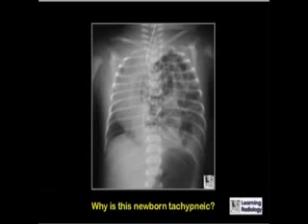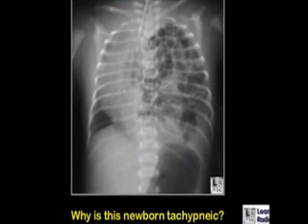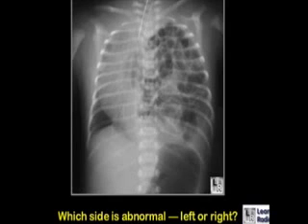Why is this newborn tachypneic? Well, one of the first things you have to ask yourself whenever you're looking at any image is, number one, is it abnormal? And number two, which side is abnormal? So which side is abnormal? Is it the left or the right?